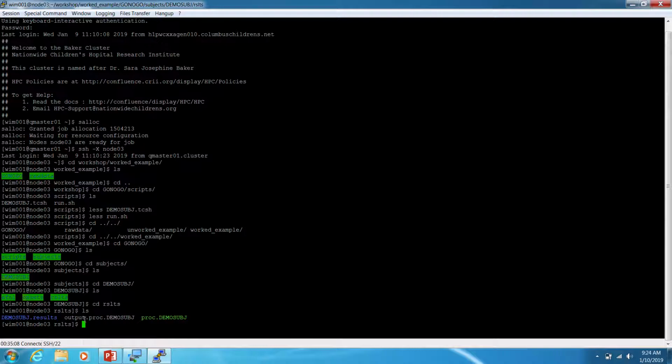This is our real results folder, so here we end up with the output of the script, and this is the actual script that it ended up running. That's just the translation of everything that we typed in AFNI ProcPy into a form that it can just run.